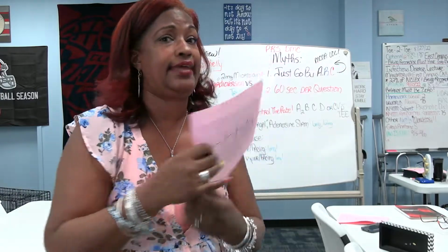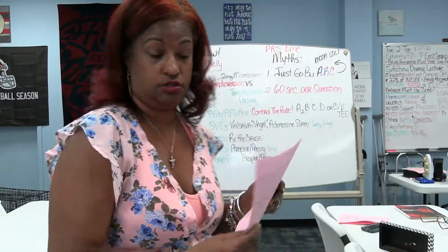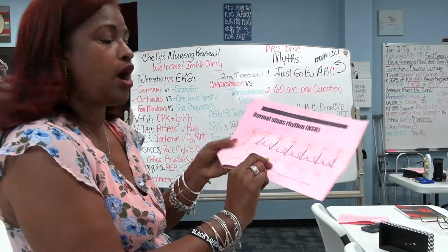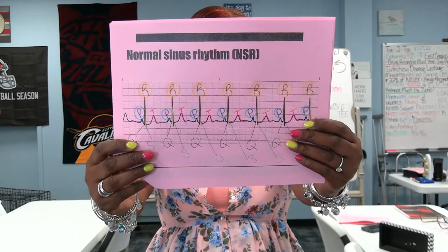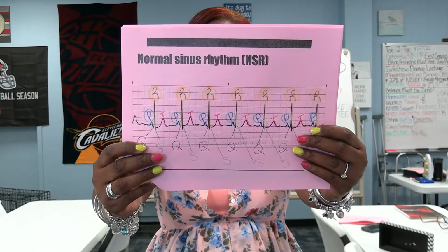But for now, if you just kind of measured it by looking at it, like, oh, look at that, that's what I need you to do. If you just looked at it, if you were honest, you could say the spaces between the R's are exactly equal. There is no big space on one and a tiny space on another.